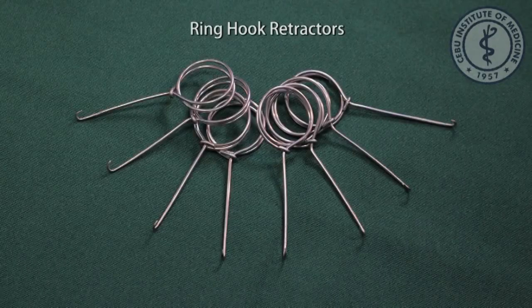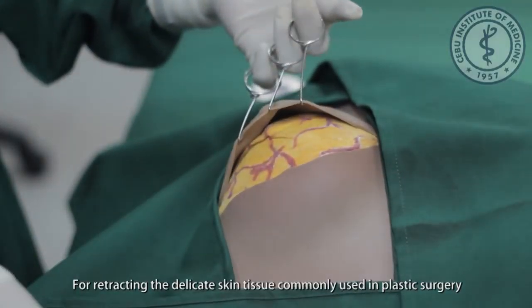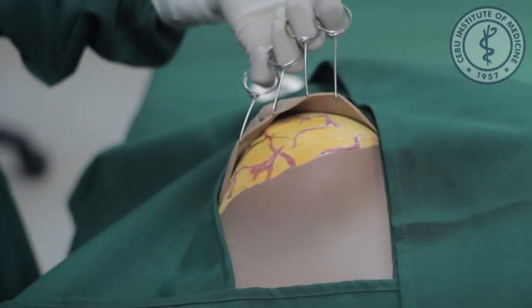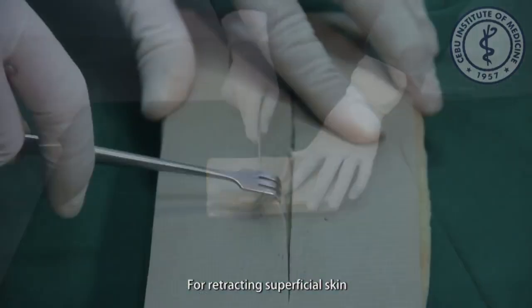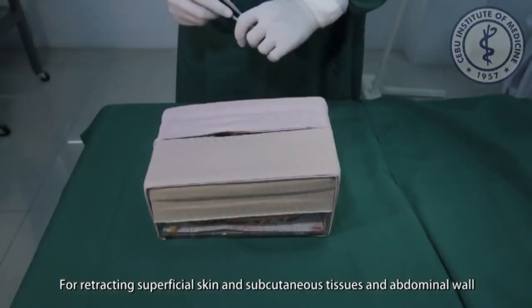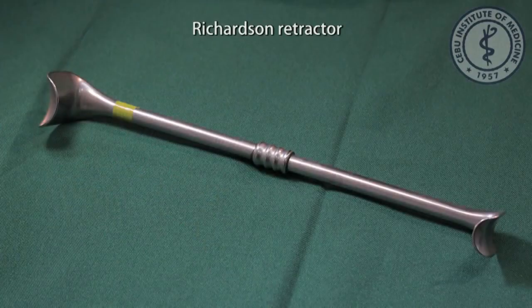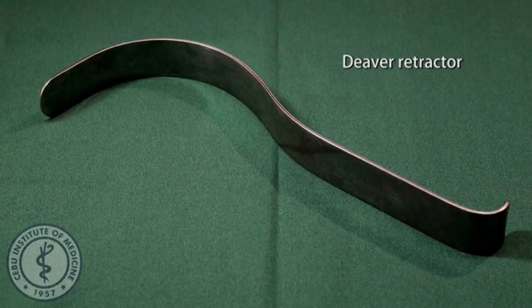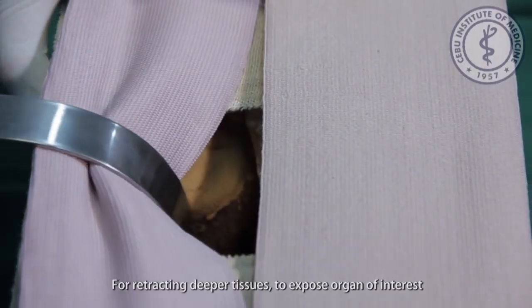Retractors. Ring hook retractors, for retracting delicate skin tissue, commonly used in plastic surgery. Senn retractor, for retracting superficial skin. Army-Navy retractor, for retracting superficial skin, subcutaneous tissues, and the abdominal wall. Richardson retractor, for retracting muscle tissue. Deaver retractor, for retracting deeper tissues to expose the organ of interest.